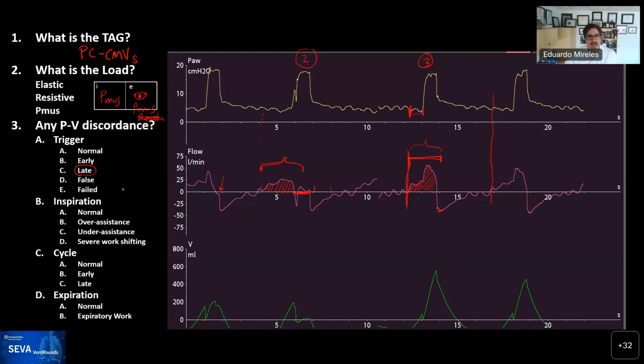So you see how, and what happens is that this patient is actually, when the breath gets reset, to start the breath gets a little bit, but the patient is already exhaling, and so only got this amount of breath in, which is this little area over here. And then the patient exhaled forcefully for all this, and then starts breathing again, but it doesn't get back to baseline because he's exhaling more than it can.